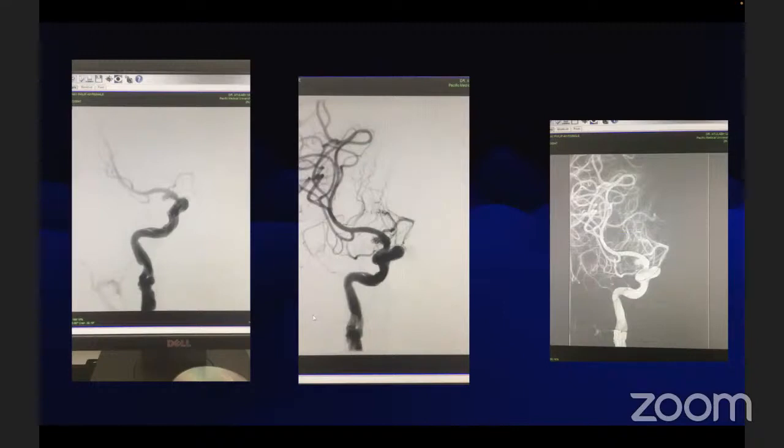It means the smaller one is actually the true lumen. Even the contrast is darker in the smaller lumen compared to the large lumen, otherwise this should be opposite. So it suggests the smaller one is the proper lumen and the bigger one is the dissected one, probably.